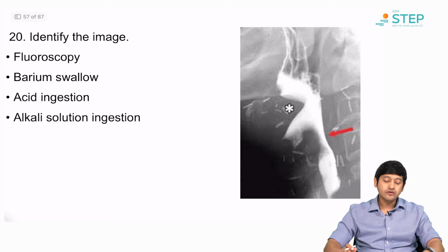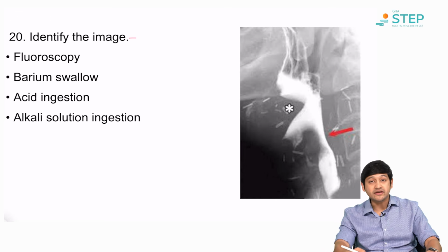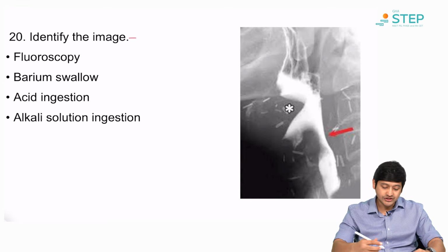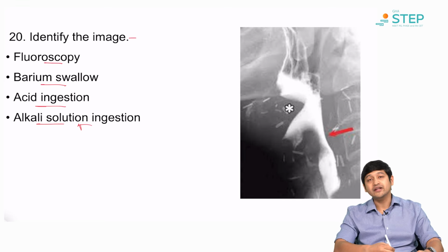Good. So now you have to identify the image, or rather identify what modality or what has been given to you. So this can be a very tricky question depending on what options have been given and depending on the coverage. So you've been asked, is this a fluoroscopy? Is this a barium swallow? Are you looking at alkali ingestion or acid ingestion? So has an alkali solution been swallowed?